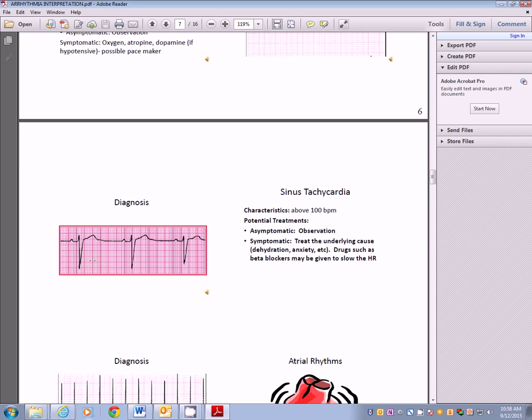Here's another one with a heart rate of 30. Again, this is in a different lead. So you've got your P, QRST, P, QRST, P, QRST. Everything's there. It would walk off if we were to walk it off. There's also something called calipers that you can buy. Paper does just as well, but I will show you an example so you know what the calipers do.